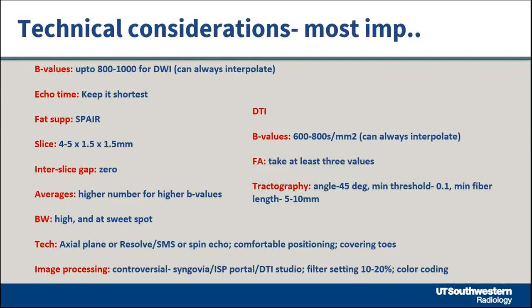That's the point you want to choose for your DWI and DTI, so try to manipulate that. Finally, image processing: you can do color coding. I'm going to show you some images, and keep your filter setting at about 10 to 20%.